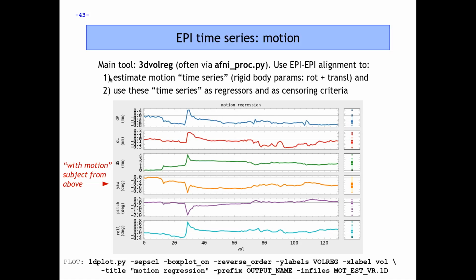And so you can see that we basically have something like a time series of motion parameters. Across all our EPI time series, how much do I need to translate it along the anterior-posterior axis to make it look like the reference volume? Same for all these other parameters, and these are just a box plot summarizing them. Note the units on these are different in each window.